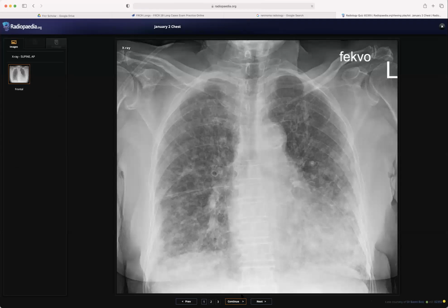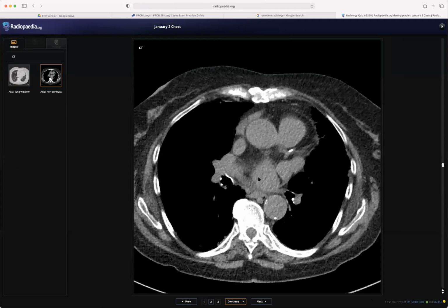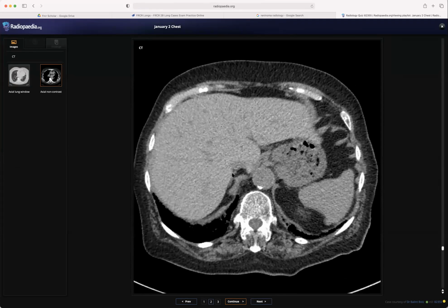This case was an amiodarone lung toxicity and hepatotoxicity as well. The clue, you have described it very well. It is a UIP pattern, and you gave the differential for the UIP pattern very well. Then when we reach the mediastinal window, we have to notice that the liver is hyperdense, although this is a non-enhanced scan. So this is the clue that this patient is having some kind of lung toxicity, and of course amiodarone is the most common drug to give this picture.